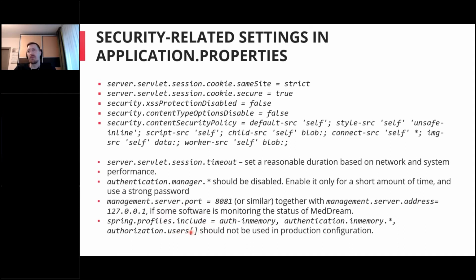These settings sometimes could be accessed from the internet, from the outside or through the network, and sometimes you do not think about it. But it is quite important, even in the testing phase, if it is accessible through large networks. So consider disabling and changing all this information.